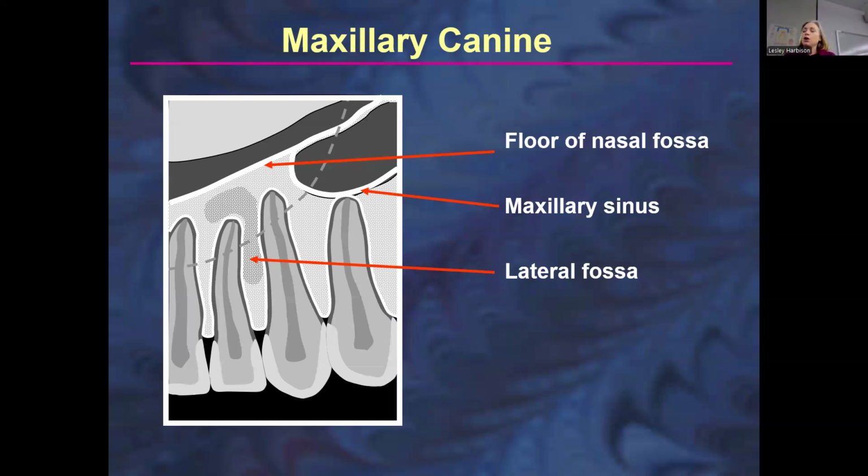And that's the landmark, where those two things converge. But what will help you determine what you're looking at when you look at that canine picture and see the inverted Y, to identify the difference between the fossa and the maxillary sinus, is to look down and see what teeth are below those landmarks. So what's below your nose? Your centrals and your laterals. If you're looking at a nasal fossa, you should look directly down from that image and see your central and your laterals. Then, if you go a little bit posterior, you start to get to the beginning of the maxillary sinus. What's directly below that?